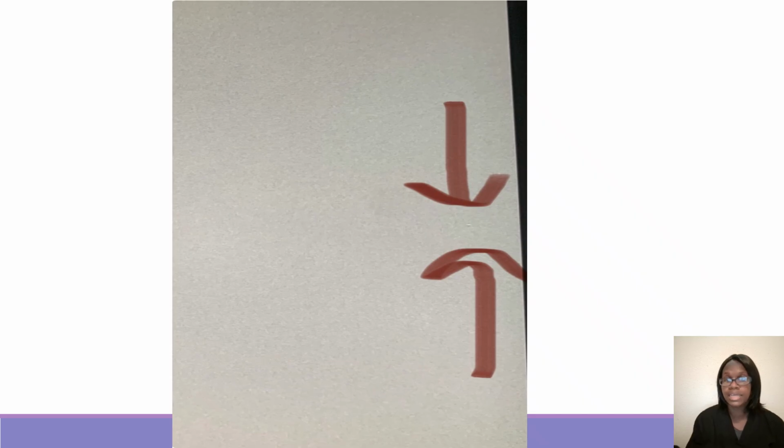And then this is an artifact that was seen during QC. Whenever my coworker was doing the QC, she noticed this artifact. Let me circle it so you can see. I highlighted that on my phone, but you can see inside of that yellow circle, that small white speck. So what happened, she let the manager know. The manager called a service engineer to come and do some calibrations or their own QC. And once they did what they needed to do, this area got cleared away because they had to do the QC again. And the patients did have to reschedule.